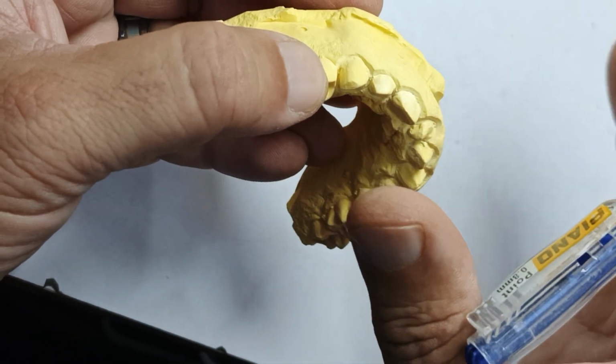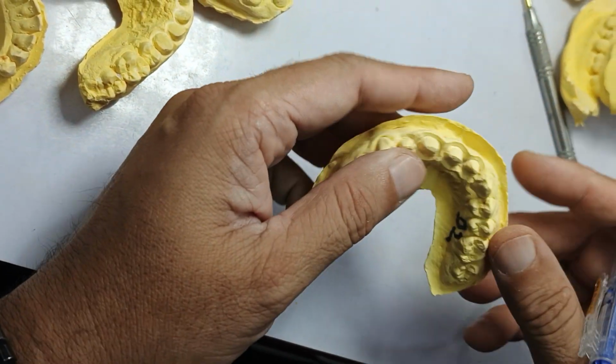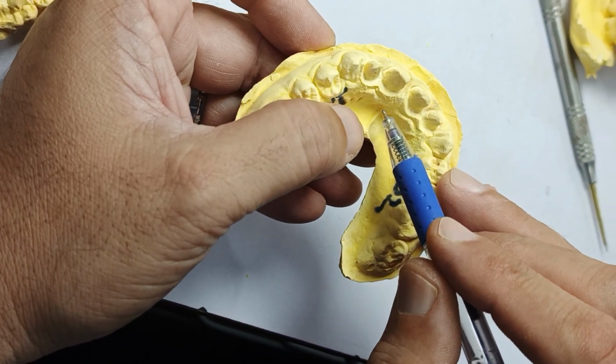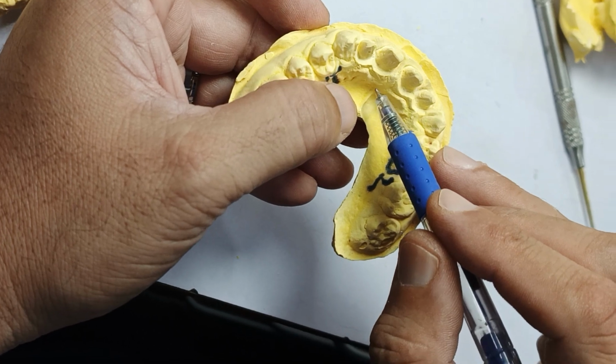Now the margins are going to be big, and they'll be cemented inside the mouth, money put in the pocket, and you go for umrah. Wonderful, mashallah. Take a look. The lab had to cut the margins again. You're earning haram. This is like taking pig meat to the house.